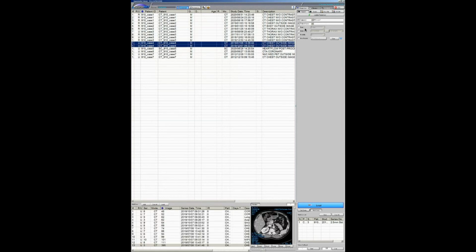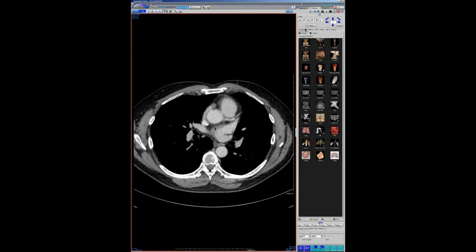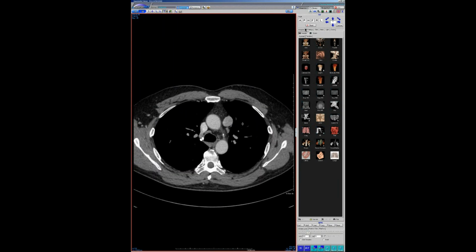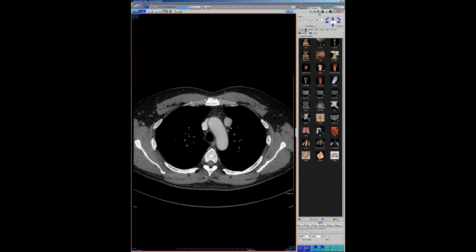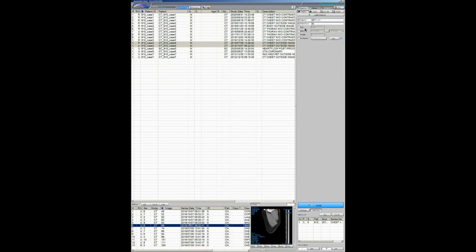This one again. Oh, is this the case? I think it is. Yeah, so this is one of those things where the patient literally just has this anterior mediastinal nodule, and I see one of these every few years. He has a little bit of surrounding nodes that definitely makes you think maybe this could be something else. Let me find the older study. Oh, no, that was the older study. But nothing else really.